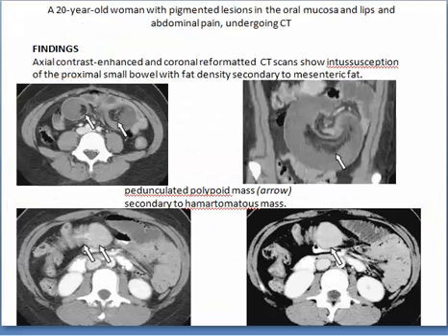In this case, there is intussusception, small intestine into small intestine, and this intussusception is seen as hypodense in CT due to fat. Loops with the mesentery and mesenteric fat are seen as hypodensity collapsed loops within the intussuscipiens.